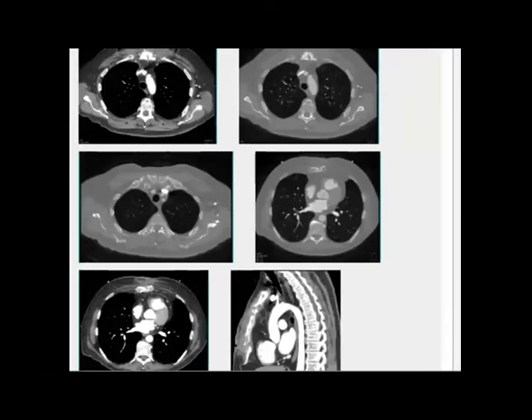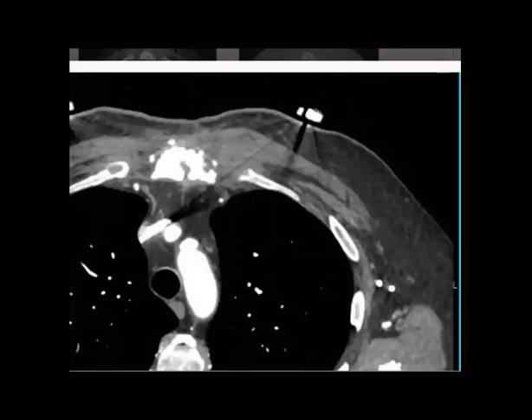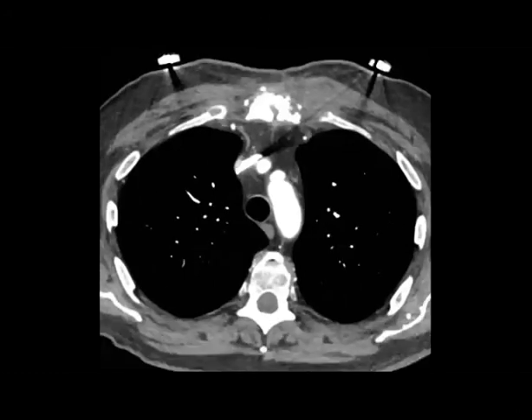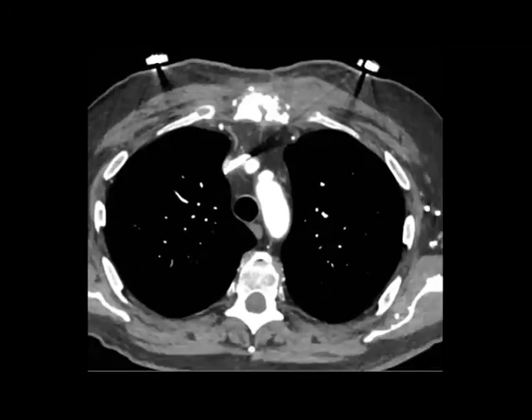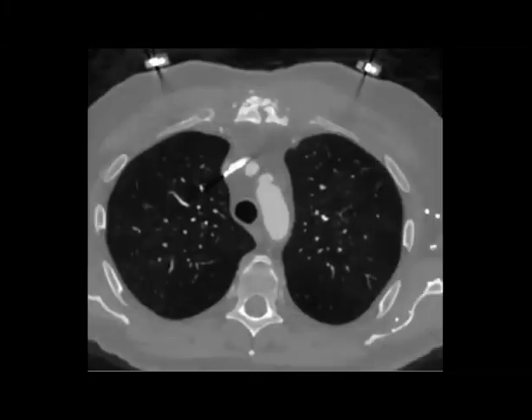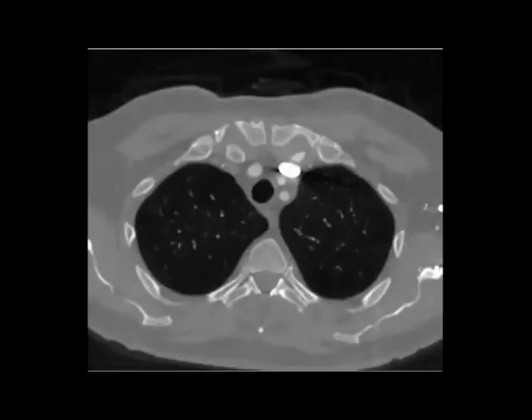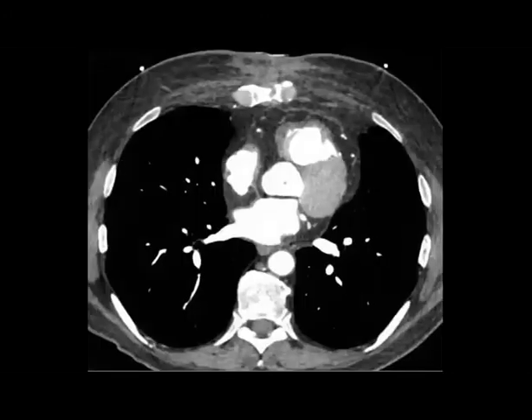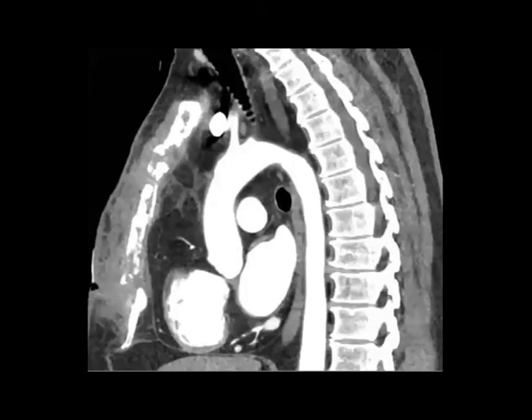Now we are going to check something like this case. It is more in the long cases, so you need to make a description. Sure, for us it will be a quick description. Try to collect the findings. Write shortly what you find. Then finally get the answer. I think this image will be the key for you.